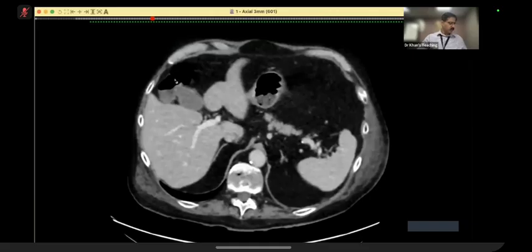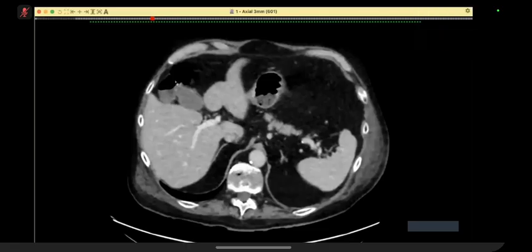Now, what happened was that the patient developed abnormal blood culture with signs of infection. They did a urine culture, which was normal. So there is infection going on. Microbiologists have advised imaging. They want us to tell them what is the source of infection. Over to you. You have to tell the source of infection to the microbiologist. Over to you. Okay, I will request the remote.